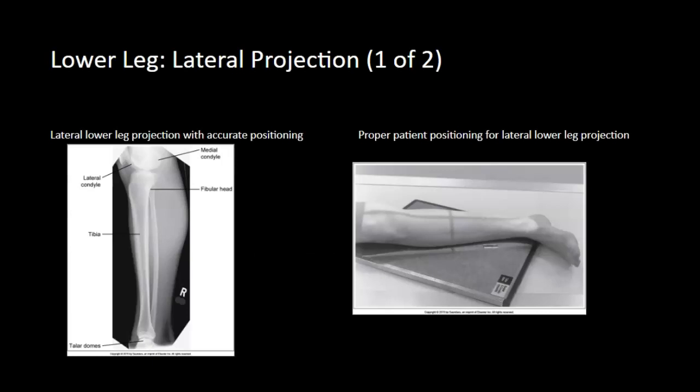The image analysis guidelines for the lateral lower leg state that the tibia should superimpose about 1/2 of the fibular head. The fibular midshaft should be free of tibial superimposition. Posterior aspects of the distal tibia and fibula should be aligned.